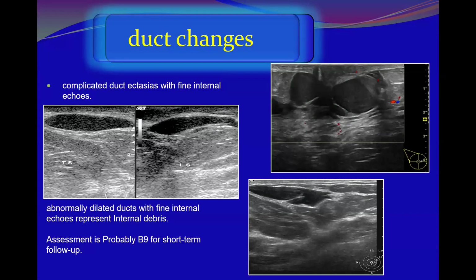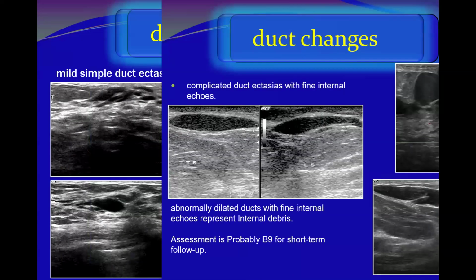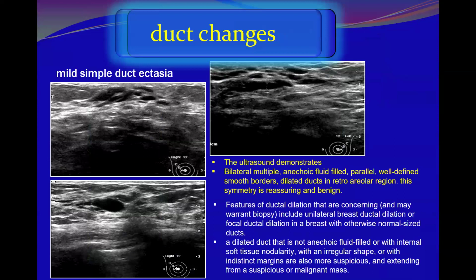I have to search. I have to make sure that this duct does not indicate an underlying malignant process. But if I couldn't find any associated suspicious features, then I will not go further. Although this is from the literature.